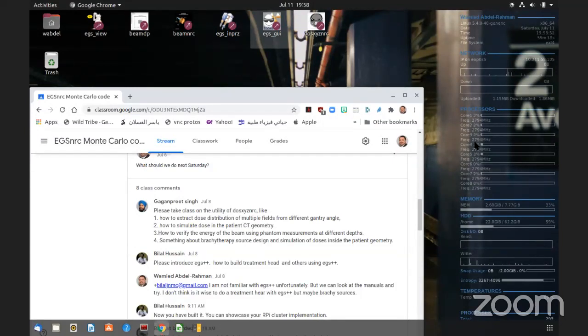You're going to get the phase space file and transport it to patients, so you put it at a different distance, at the exit of your machine. Probably that's going to be 60 or something. I'm not sure with a cobalt machine. Okay. Anything else?